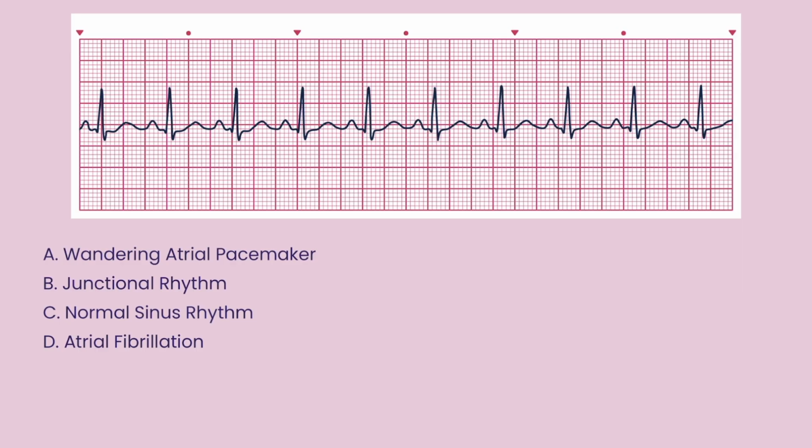All right, what do we see? Normal rhythm. P to QRS is 1 to 1. Everything seems to be pretty normal. I think this is actually just a case of normal sinus rhythm. Now remember, when you're given a rhythm strip, I don't really like it all the time when they give you a normal one, but your job is to know what normal looks like. So don't trip yourself up and try to look for a problem. Sometimes it's just normal.